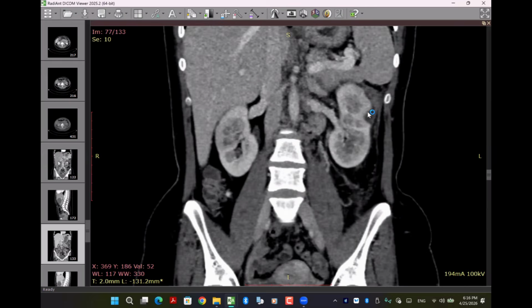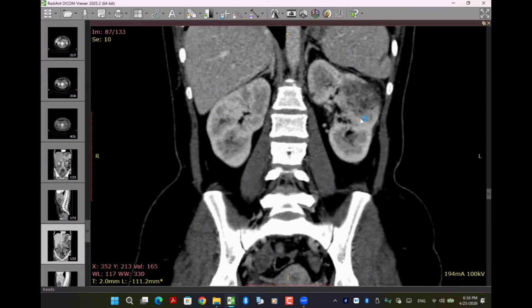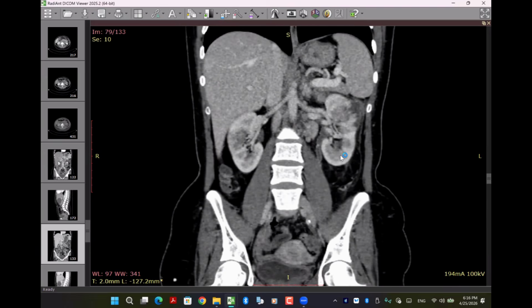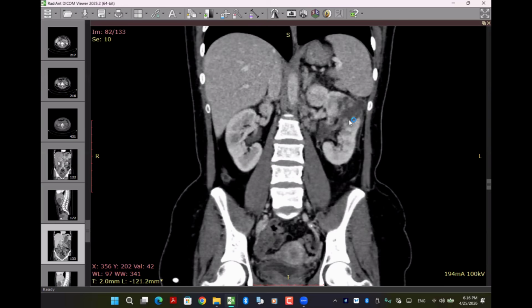Now I can see that there is enhancing walls around this collection as well. Nice. So we can differentiate this from infarction by the extrarenal finding. The moment you are biased between infarction or an inflammatory process, stay away from the kidney and look at the extrarenal space and other organs. It can help you to define your diagnosis. Is it infarction? Is it pyelonephritis?